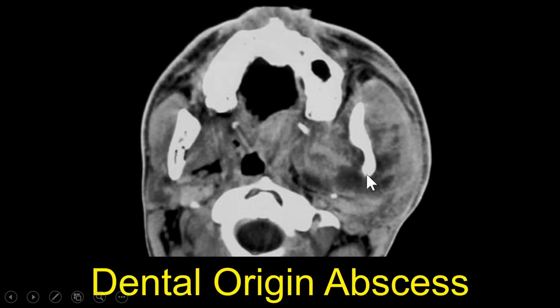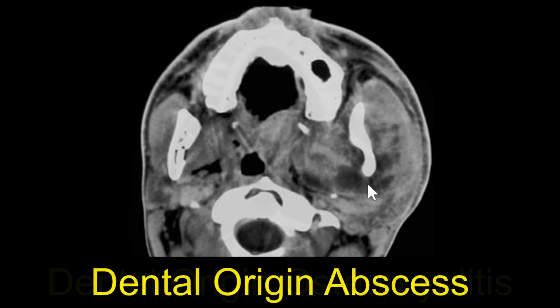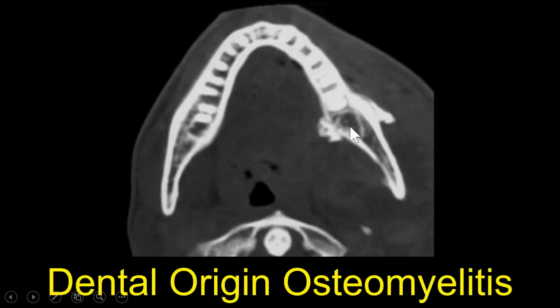Again, this looks like an abscess adjacent to the mandible, so we're going to think about teeth, and we're going to look at the teeth very closely. We find that parapharyngeal fat, and we see it's pushed medially and posteriorly, helping us guess that this lesion is arising from the masticator space. That's where the muscles of mastication are normally. We see the masseter here out laterally and the medial pterygoid, medial to the mandible. So on this side, we have an abscess adjacent to the mandible. So we want to look very closely at the teeth. And sure enough, this patient had an empty tooth socket from a tooth that was recently removed in that case.